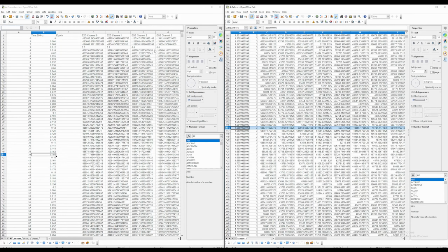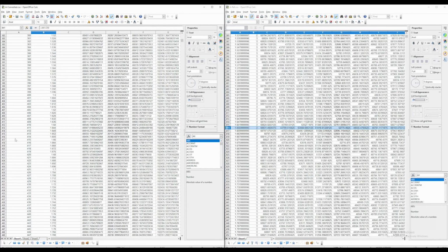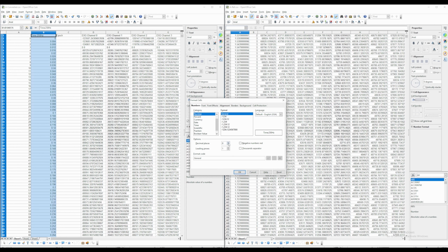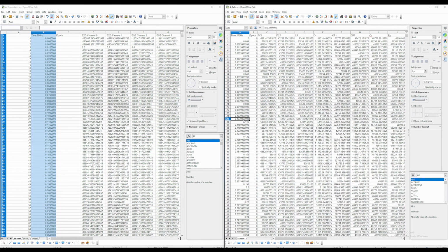So if we compare it to our reference file, let's see, the, I don't know, 416th sample. Is it the same one here? Yep. We have 1.655, we have 1.656. These are going to be similar in the end anyways, but this is the result. It matches our reference. So that was pretty easy. You can also format it to have more decimal places, so it would represent what we see here. But OpenVibe isn't super strict about these, at least for reading.